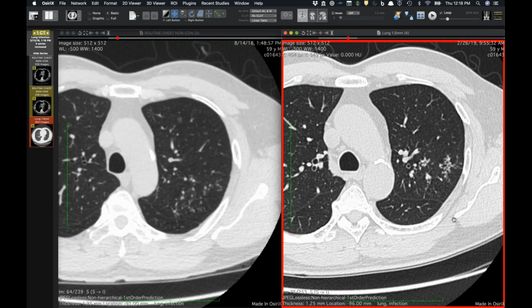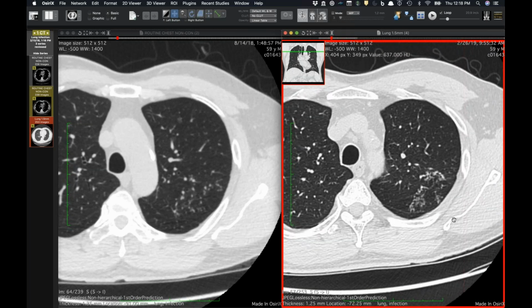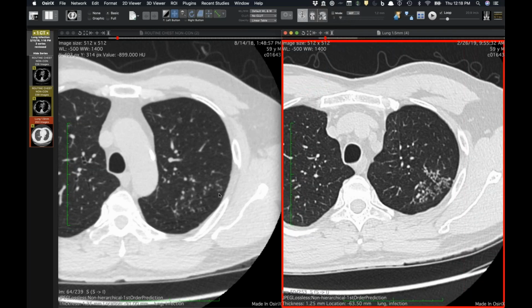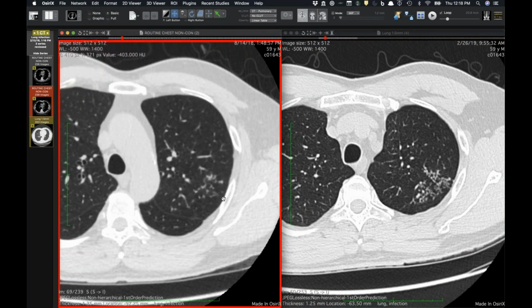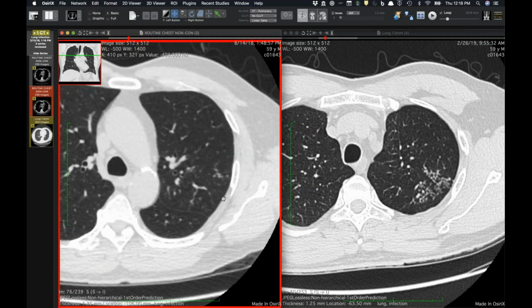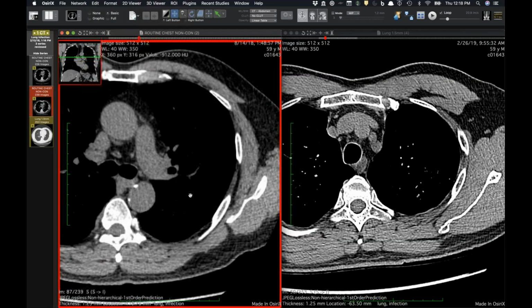Yeah, so Travis, I agree, it looks like both here. And we see this with histoplasmosis where you see the dominant nodule and you'll see little nodules along the draining lymphatics. And over time, we'll see that even the calcified nodules go that way. So it doesn't surprise me. It starts as a bronchiolitis, and then you get sort of a TB lymphangitis that goes along with it. Did he have any lymphadenopathy in that draining pathway? No. Okay. Nothing.